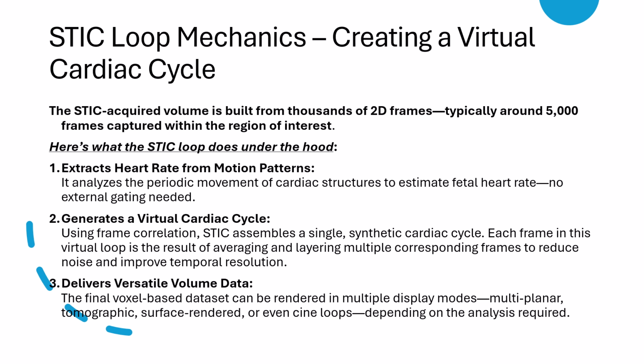The final product is a voxel-based dataset, which offers flexibility in how we analyze the heart. This dataset can be rendered in a variety of display modes, whether you need multiplanar, tomographic, surface rendering, or even inversion scenarios. This versatility allows for detailed exploration of the heart from multiple angles, depending on the clinical question at hand.